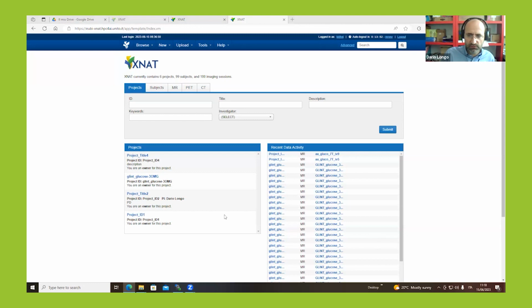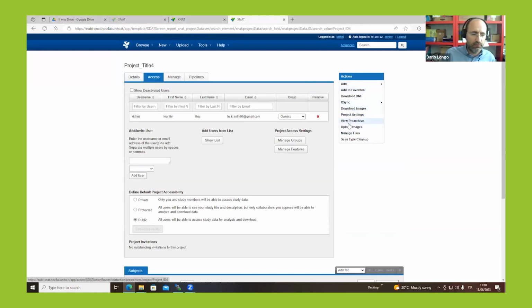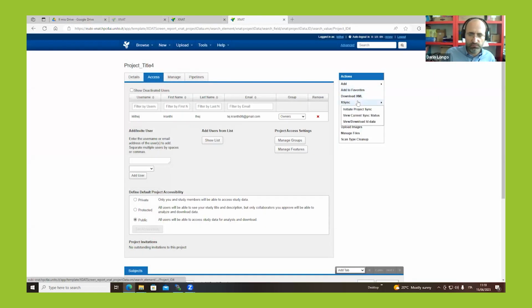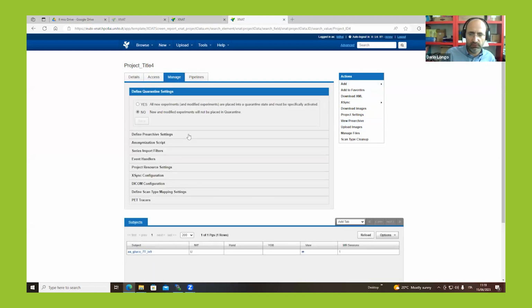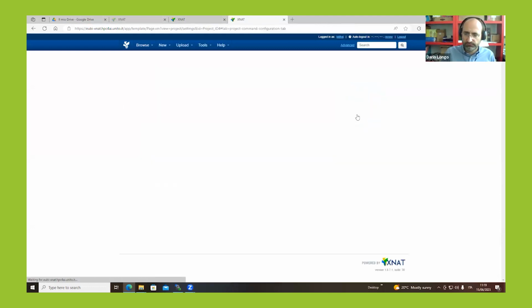So for sure, you can save a transformation matrix coming from other software and associate it to a specific scan, to a specific image. However, you will not be able to exploit this transformation matrix in the OHIF viewer. But you can exploit it when it's saved in the XNAT platform, meaning that you can read it and apply it to the DICOM images stored there. So this means for the processing step.